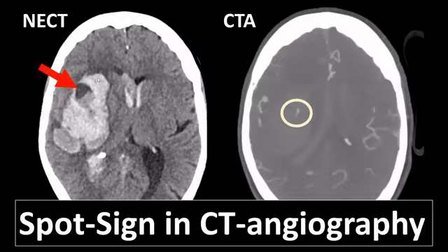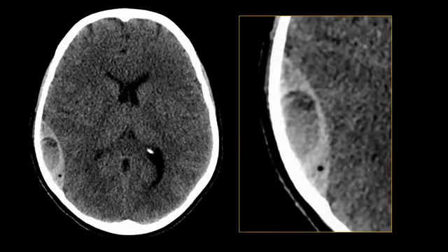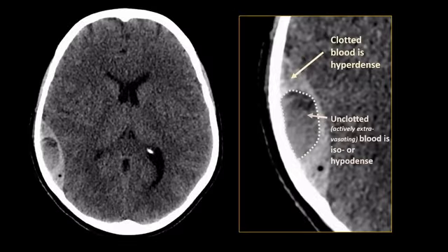And we see that the hematoma is largely hyperdense. So this corresponds to clotted blood, but this is the unclotted component. Unclotted components in a hematoma have also been described in epidural hematomas and have received a well-known name. Let's look at this epidural hematoma. So we see in the periphery hyperdense clotted blood, but then we see this central component which is heterogeneously iso- or hypodense. And this corresponds to also active hemorrhage within the hematoma. So this patient is still actively bleeding.